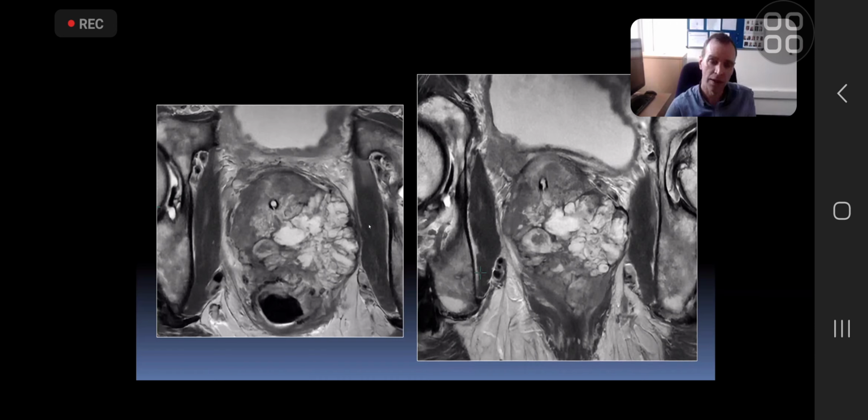And I think you mentioned that you thought that they might be necrotic nodes or they might be septic nodes. Certainly there was some low attenuation in several of the lymph nodes in the upper abdomen and the pelvis. And that's probably not surprising given this cystic appearance of the primary, because often the nodes look like what the primary looks like. So if you think of squamous cell carcinomas having quite necrotic nodes and osteosarcomas that can be calcified, the nodes are often calcified. So it's not uncommon for the nodes to look a little bit like the primary. So I think these are cystic necrotic nodes rather than septic. But we can see a lot more detail with MRI, okay?